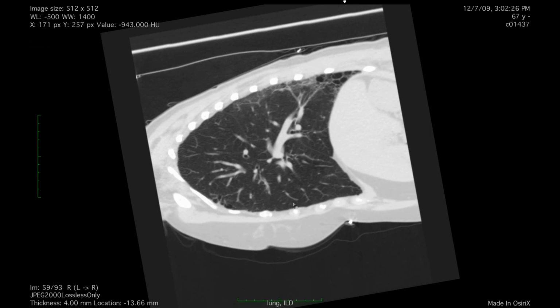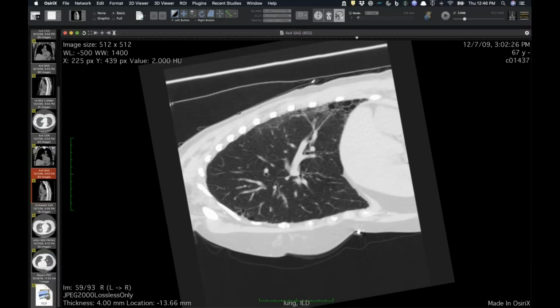This seems to be just sort of magically way out there at the periphery without tracking out there from centrally. So, aspiration's fine, I think, for the lower lobe stuff, but I think this case is not very convincing to me, at least, that the anterior component is the same process. So localized. The central part is so pristine.